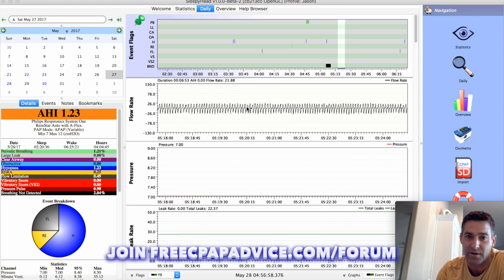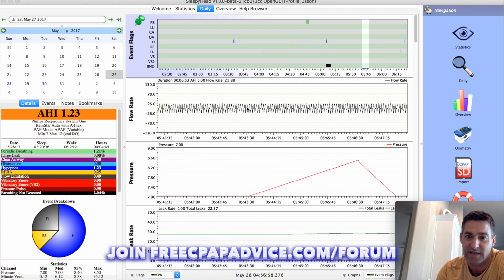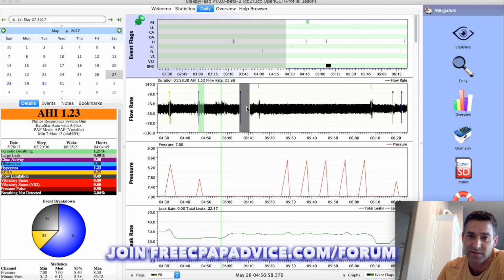So this is a nice sample. This whole period here, very, very uniform breaths. That's exactly what you want to see. That's perfect. So I'll zoom out and you can see this whole night. I mean, you could put a straight edge on this, and that is absolutely gorgeous.